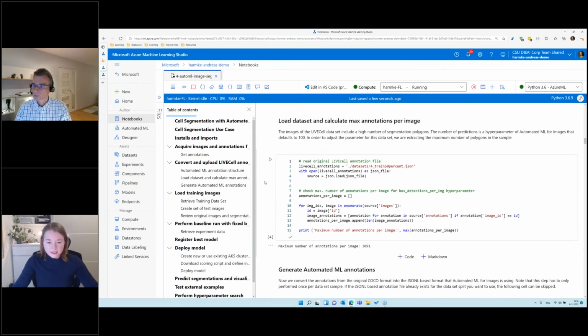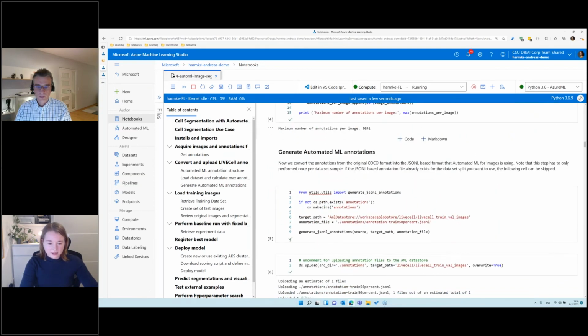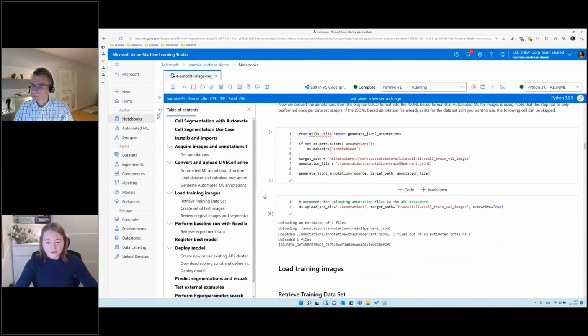So what we are doing is that we are loading this annotations file in our memory, and from there we will process it using a function that we have created. So we did some custom coding for it, but there are a lot of util files available that you can use for specific formats as well, if your labels might be in a different format.